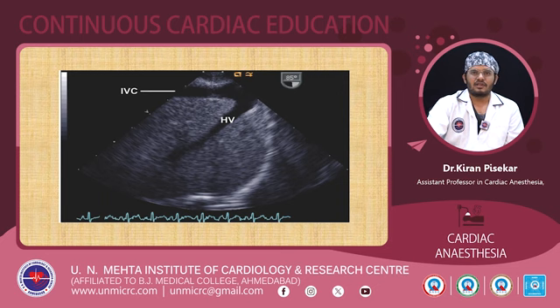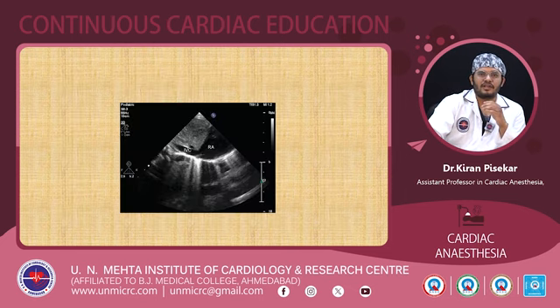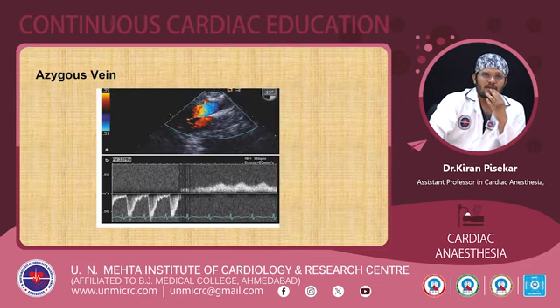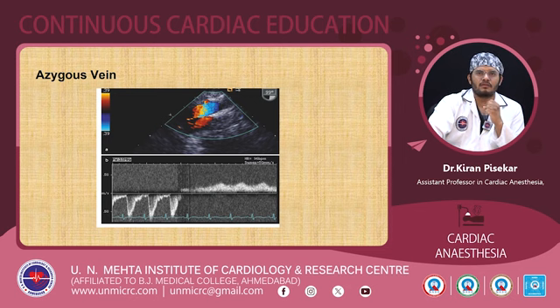Now here this is the IVC, the hepatic vein, and it will be draining into the RA, where we can see that the IVC is interrupted. This is the RA, but here there is interruption of the hepatic part of the IVC. Again here we can see the hepatic veins which are directly draining into the RA. Now this is a TEE image demonstrating the azygos vein, which is very difficult to demonstrate. So here we will find two vessels, one the descending aorta and the other the azygos vein, which is going towards the SVC. Here we can see the flow patterns. Pulse wave Doppler is used, and here one flow pattern is of the aorta and this is the flow pattern of the azygos. The aortic flow will be caudal, and the azygos vein flow will be cranial, towards the SVC.